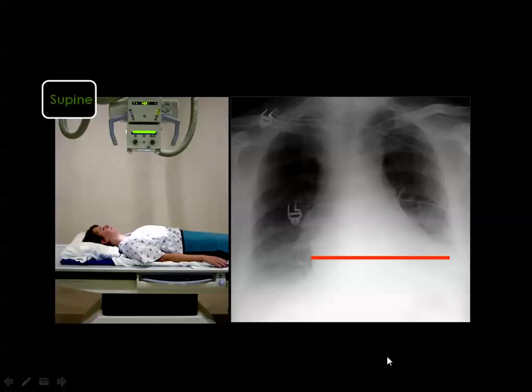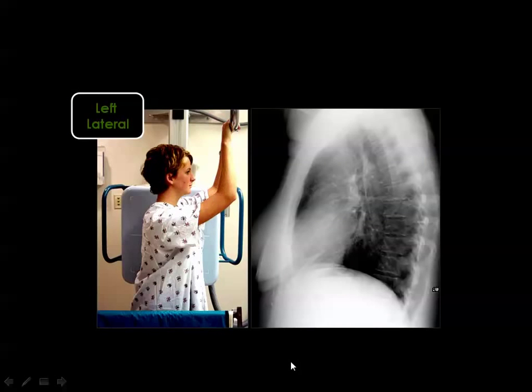And this is the case in the intensive care units and in the casualty areas, where the patient is usually radiographed in the supine position and in the anteroposterior view. Then in these conditions, you should assume that the heart will be enlarged or appear as if it is enlarged because of the supine position and the anteroposterior projection. And if the cardiac size is of interest, then you should have the lateral view, because in the lateral view there is no magnification of the cardiac shadow. Then here, this is the lateral view.